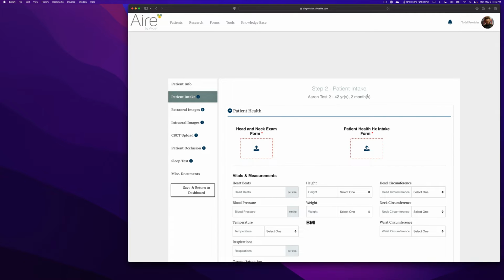So when you see the red check boxes or the red asterisks at each one of these steps over here on the right, those are going to be required fields, meaning that information is going to be required in order to move on to the next step and to complete the patient setup process. So you can see over here that each one of these exclamation points means that there's something missing that's required from within each one of these sections because we haven't gotten to them yet.